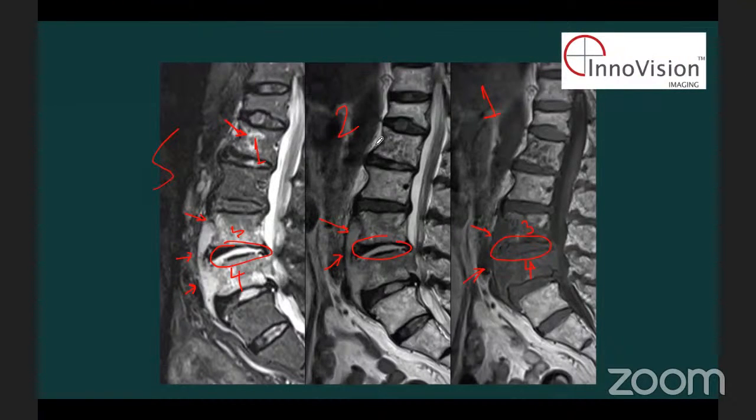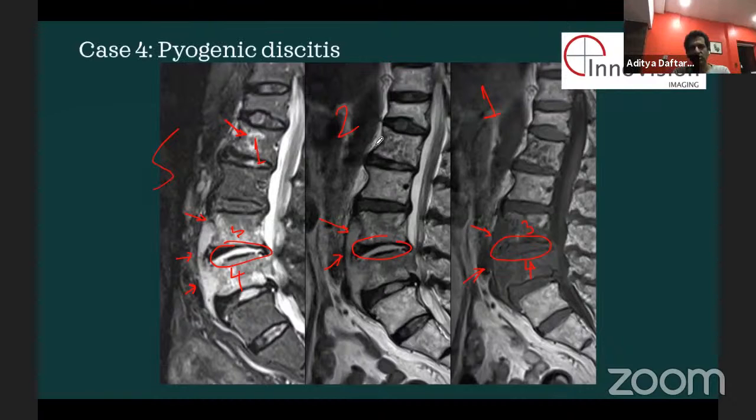It's just an incidental finding. Very good, this is excellent. This is a case of pyogenic discitis, pretty classic. And you know, this is sort of what you see.